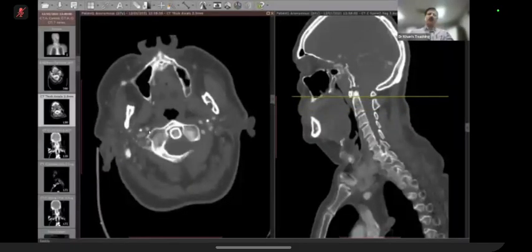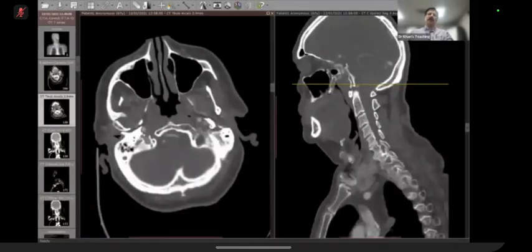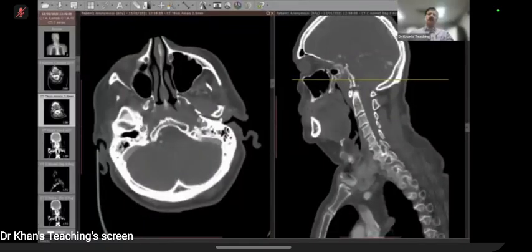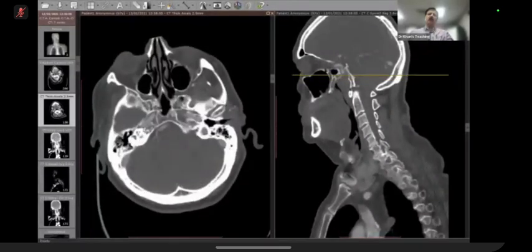And everything here together is in the carotid space. And now this internal carotid artery goes superiorly and it is touching the base of skull. And here, this is the vertical portion where you can see it as a cross section, because this is the vertical portion of the carotid canal, as we had described. Now you will see it will become horizontal. Now it has become horizontal.